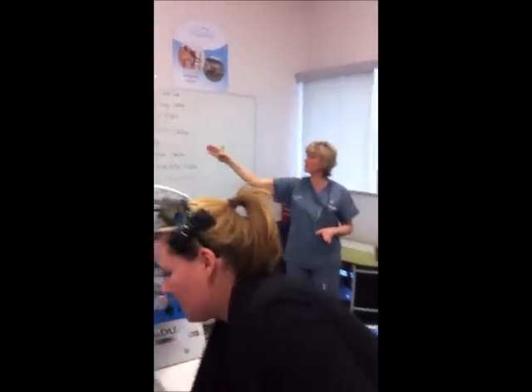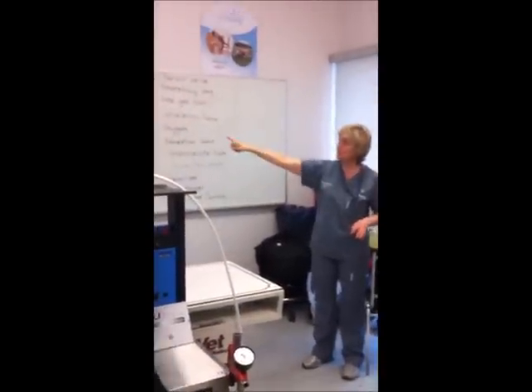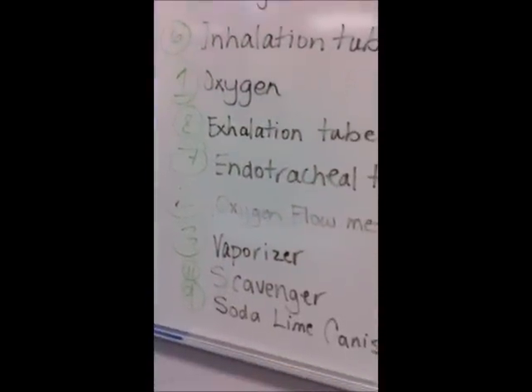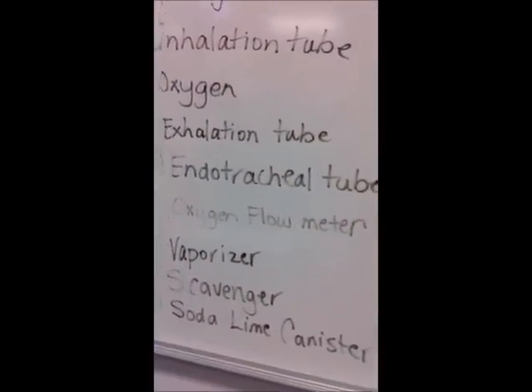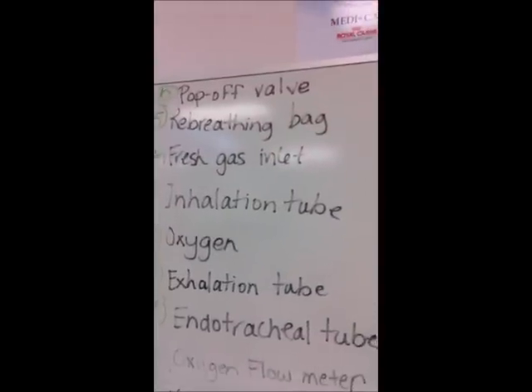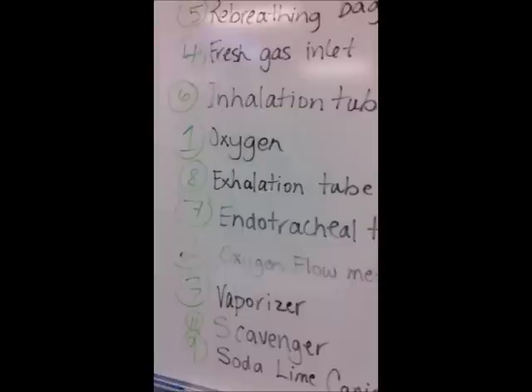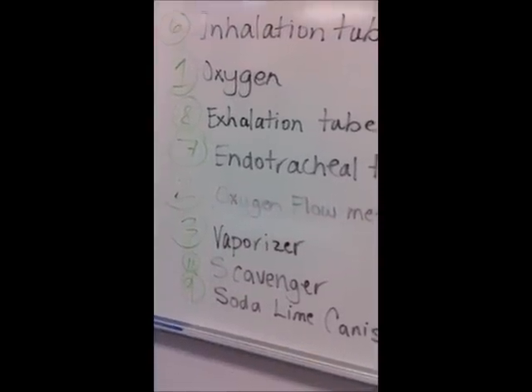But if you want to have sort of step-by-step flow, and I've written on here under this basic flow, your oxygen tank, your pressure regulator, I don't have that to show you, unfortunately, at Sheridan. So what that's represented by, I've written on there, is your white tube on the anesthetic machine. So this represents the oxygen. Okay? It's important for you to know on your O2, on your oxygen flow meter, that flow is liters per minute. The vaporizer is set in percent. So these are all things I've given you, but think about them. Make sure you're comfortable with them.